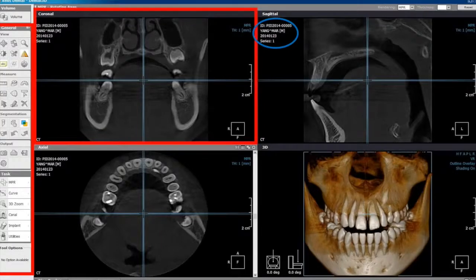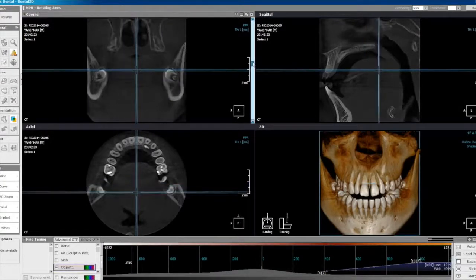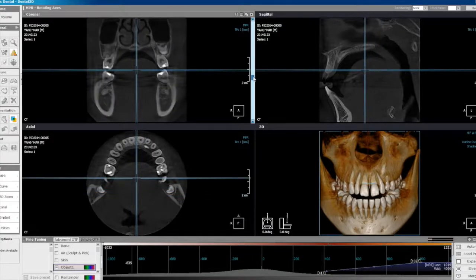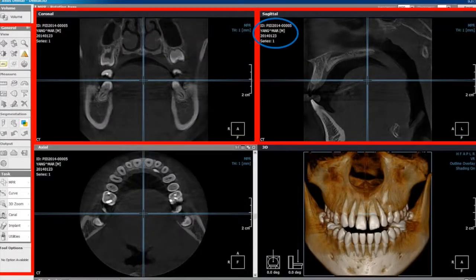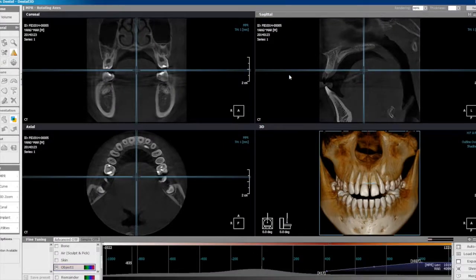Coronal plane displays cut through the anatomy from an ear to ear, and separate the anterior from the posterior. The view can be adjusted by moving the control points in either of the other MPR view. Right of that is sagittal plane. This plane displays a cut through the anatomy from medial to lateral, separating the left from the right. The sagittal plane view can be adjusted as previous.